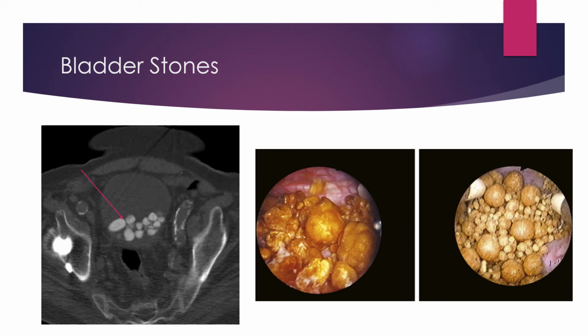And finally, this is an image of the bladder, and within it we can see lots of these bladder stones. The picture on the right again just shows some variation in the types and sizes of bladder stones.